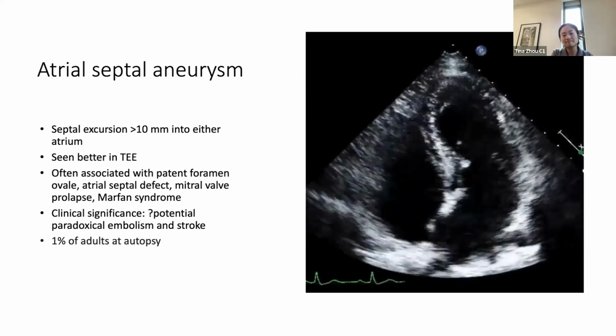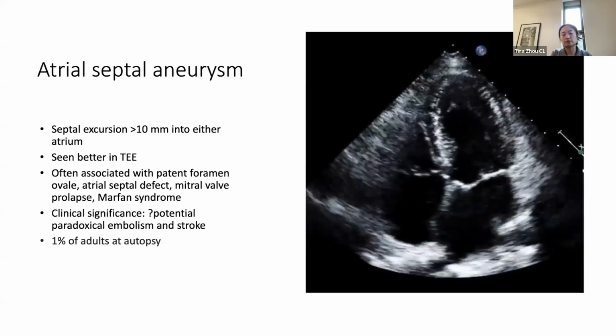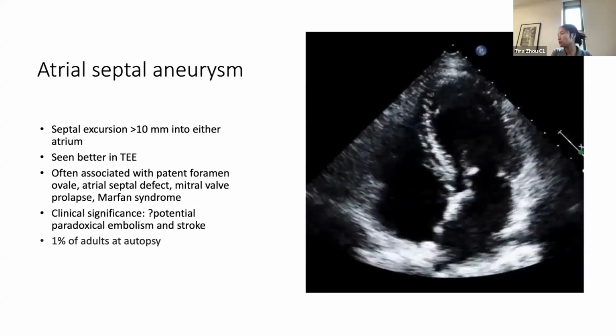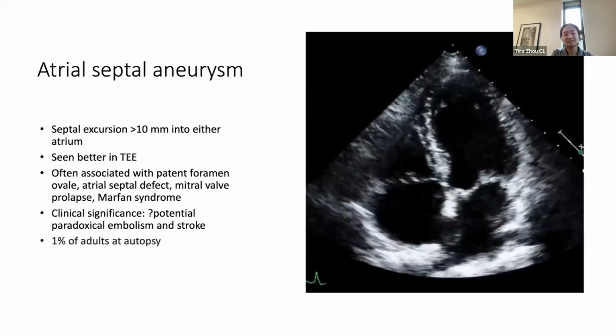The clinical significance, not sure. There's thoughts that it can potentially cause paradoxical embolism and stroke, but the prevalence is really not that clear. It's not super common. At autopsy, only about 1% of adults. Well, that's in MICs, I would say everything seems more common than the literature.